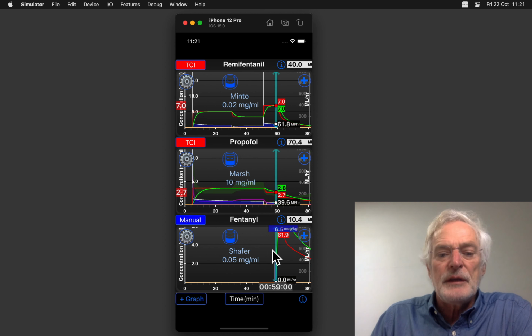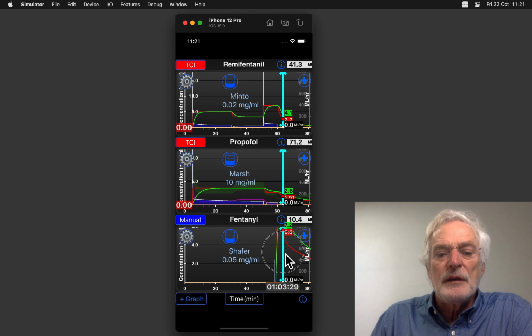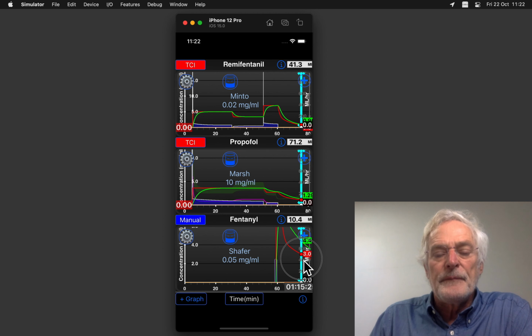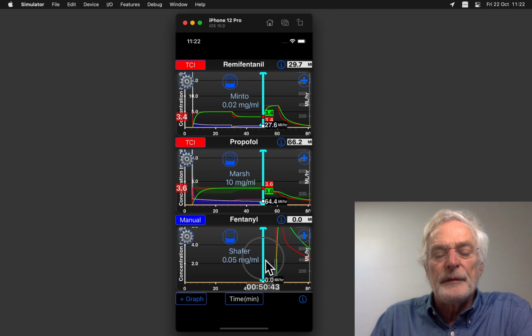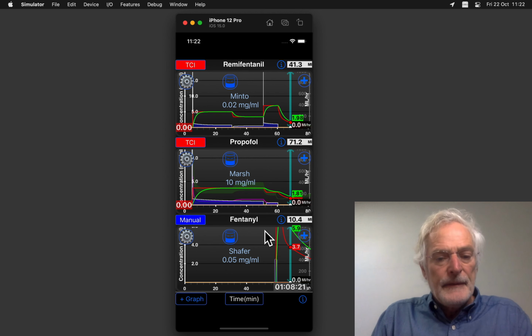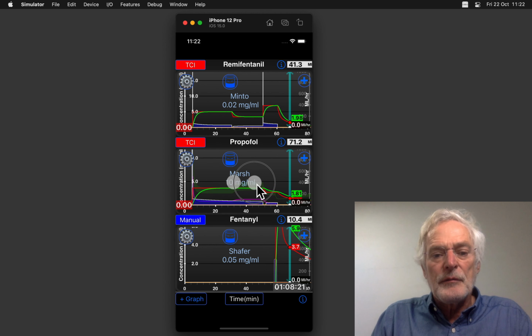And you will see that this bolus will increase the adequate anesthesia, decrease the adequate anesthesia, and it may take a quite long while before the patient actually is going to wake up. Or it's not true. Patient is actually not waking up at all. I have to say it's also a very big bolus.